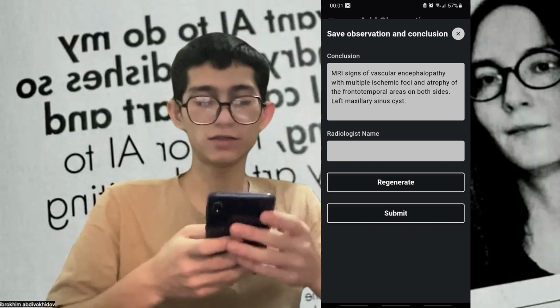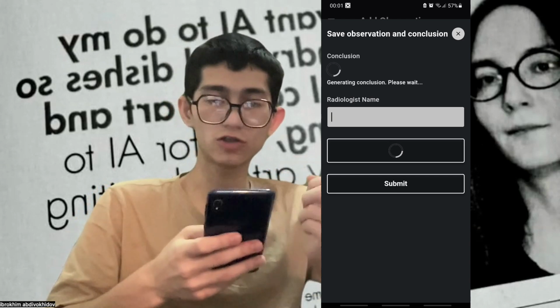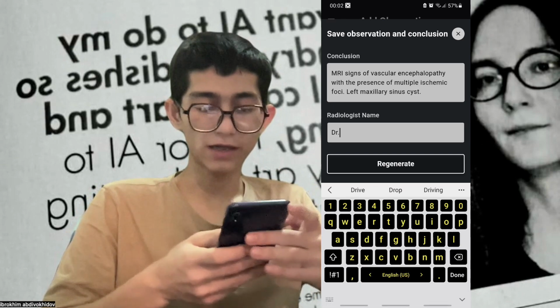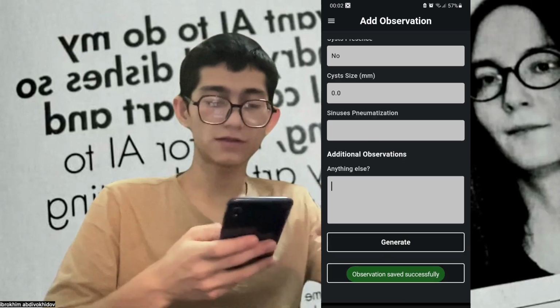Let's regenerate it. Just click on regenerate and you can see the conclusion is regenerated. Now we can submit it or simply save it. Dr. Lee. Okay, and click submit. You can see observation saved successfully.